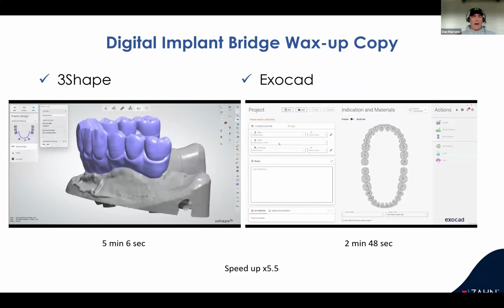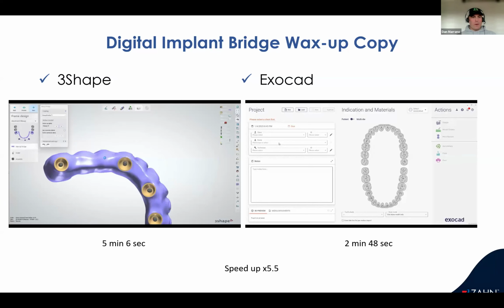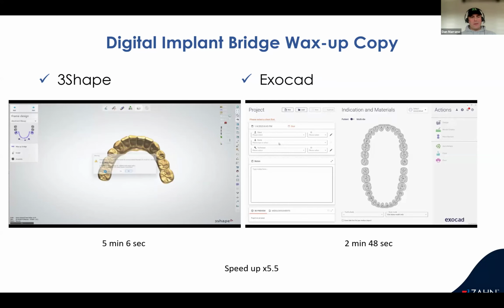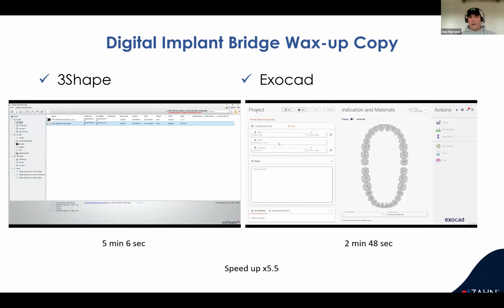it won't take a wax up. You have to be in a model. So now that our implant coordinates are there, we can go through, connect the pieces, and this is just our demo bridge. Do some angled screw channels and done. It's not as straightforward if you don't know the trick of the fake order. It works well. Some people still like to do that.